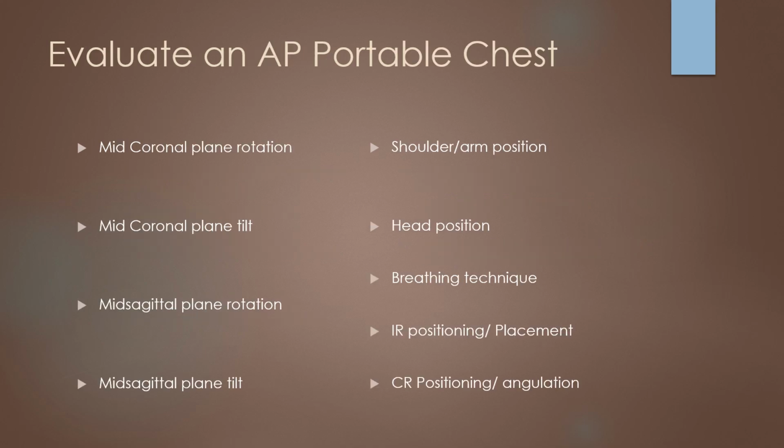Okay, so I apologize here. Please disregard the portable chest. This is for an AP abdomen. So if I positioned all of these, I'm going to have you take a look at this AP abdomen, and I want you looking at exactly what you suspect you will see if you correctly positioned all of these areas.